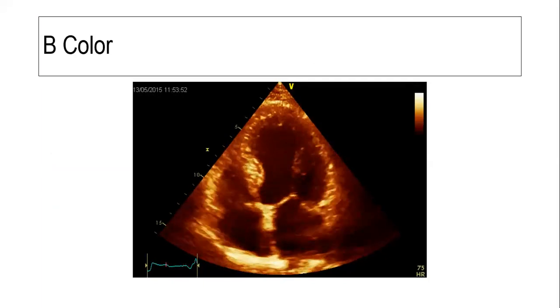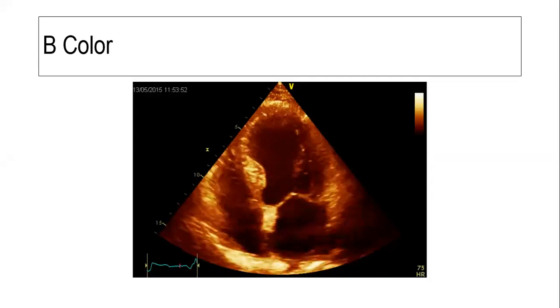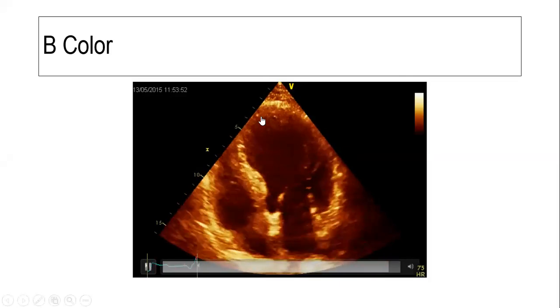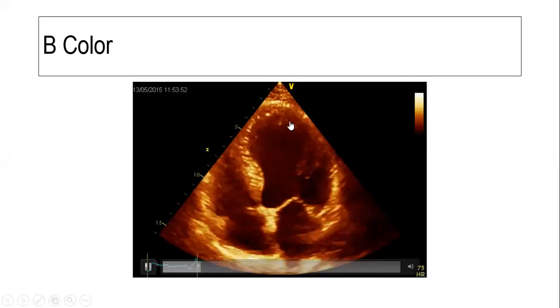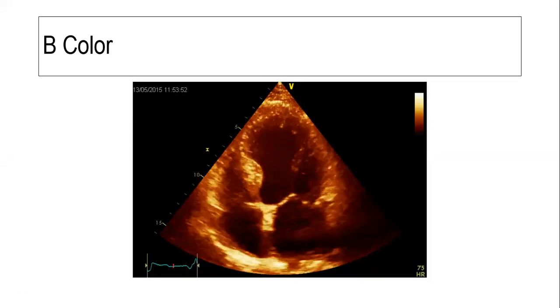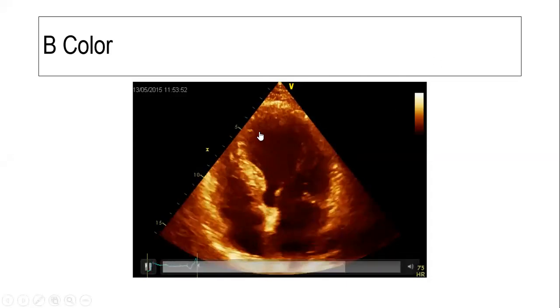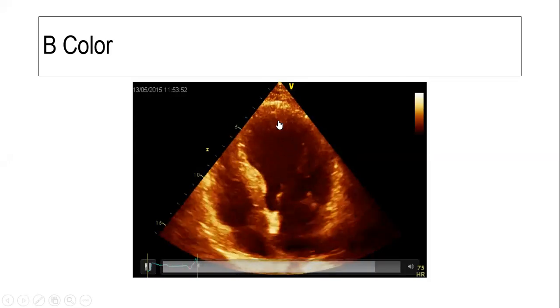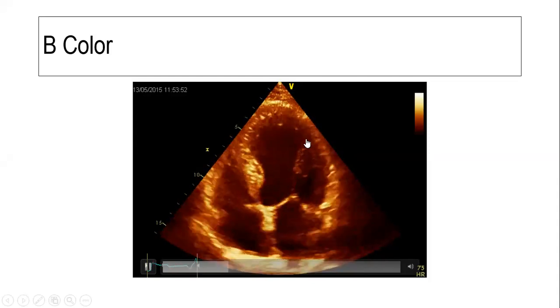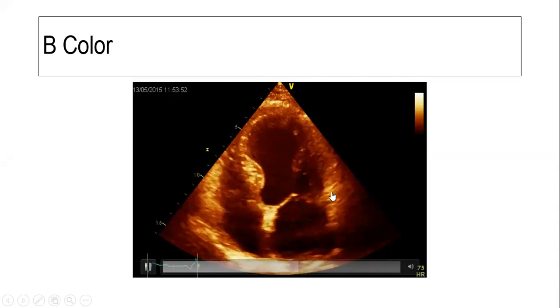What kind of motion is this? Dyskinetic. The apex is almost akinetic. From here onwards, the apex is almost akinetic. Sir, but it looks like thickening in systole. Yeah, it looks like thickening in systole. Yeah, maybe you can say that. I can appreciate this as thickness. So it could be hypokinetic. Yes, sir. And this is thickened sigmoid septum. Yes. This is a normal lateral wall. I can appreciate. Good.